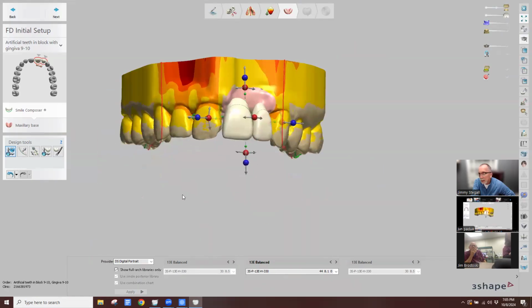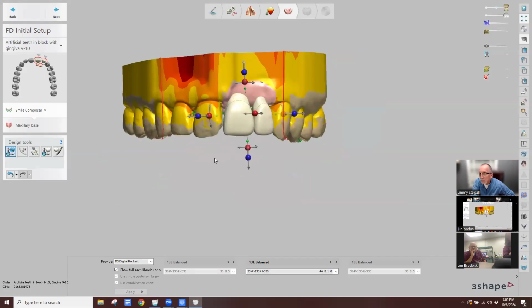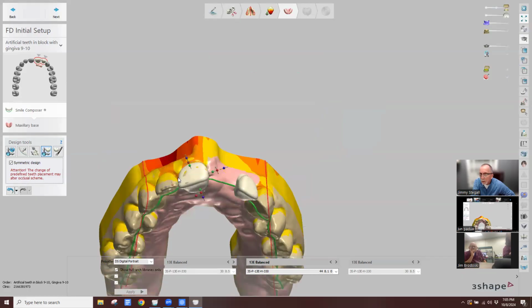And one of the things I like to do, to make sure that the mold's going to look okay, I will actually go to the individual tool, and just as a peek, put it over here, overlay that, and position it in the same position to make sure that I'm pretty happy with the mold or shape I've got.